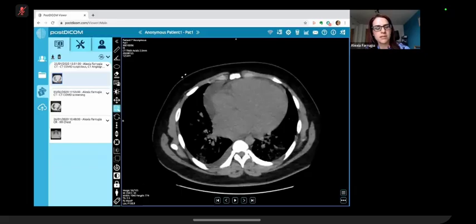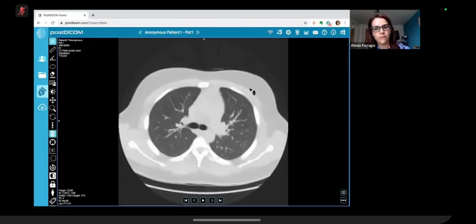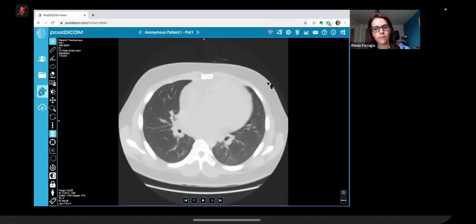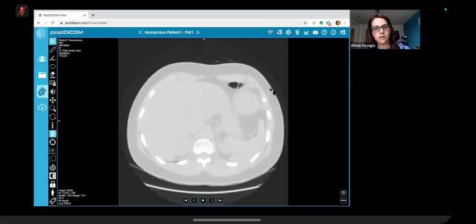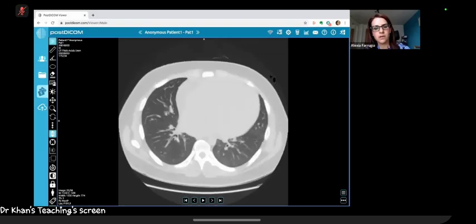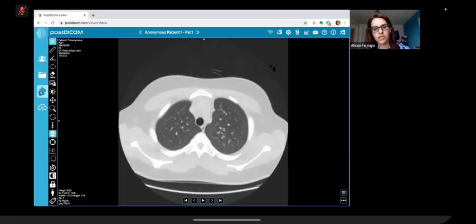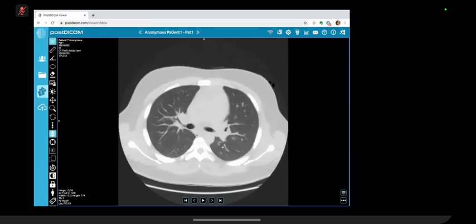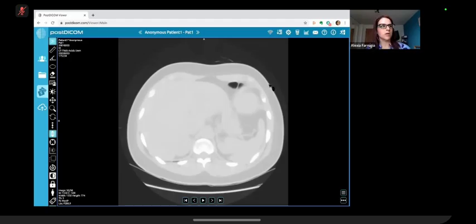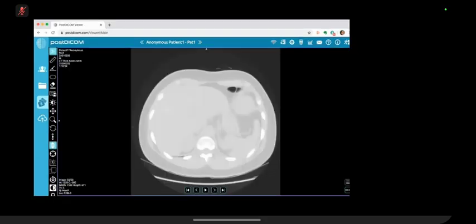Subsequently, he had another CT, which I'm going to show you. And on this, the pleural effusion has resolved. There's no fluid in the fissures. There's no edema. The heart is enlarged, obviously, but there are no residual lung changes after treatment. So that was the diagnosis for this chap, followed up by cardiology.